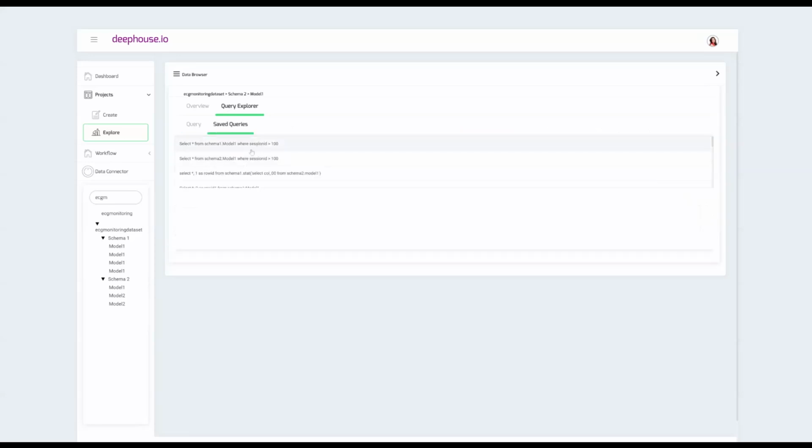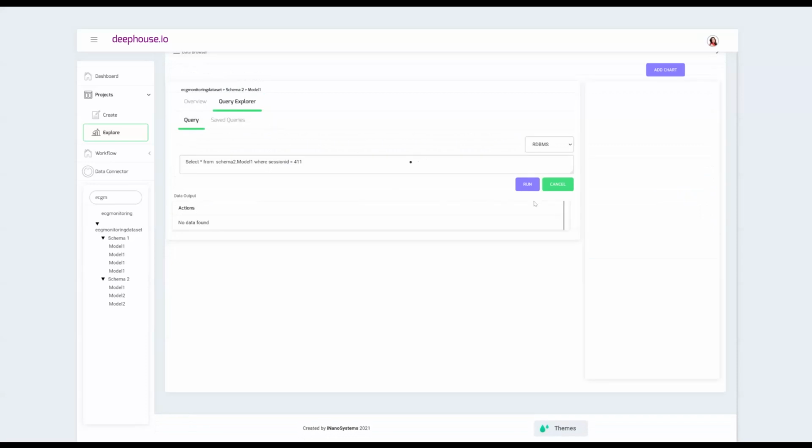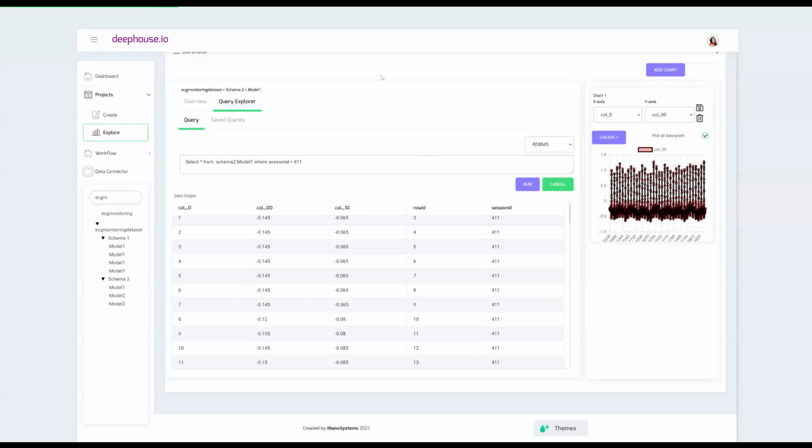So I'll take some of the queries, such as the one here, to demonstrate how the query will run and get the data, and you can plot that if required, and you can see the one heartbeat from the data, and if all the data has to be plotted, that can be done as well. Currently the zoom feature is not enabled, which will be enabled going forward.